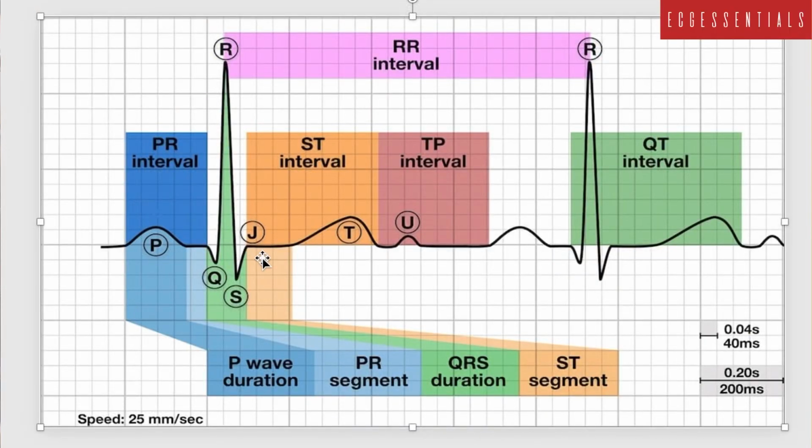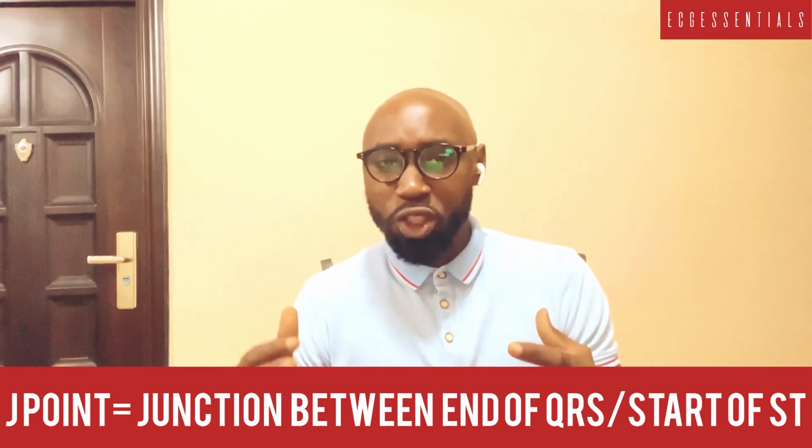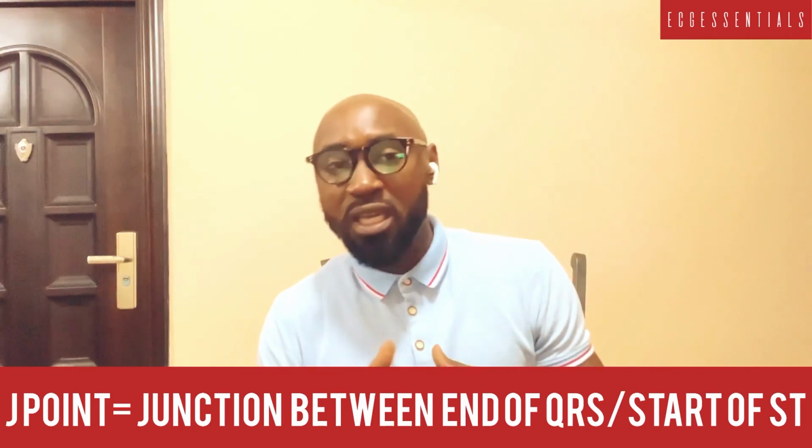Then after the QRS complex, we notice that there is the J point as shown on the image, the J point, the junction point. That is actually what it means. And as the name suggests, it is that junction between the termination of the QRS complex and the beginning of the ST segment. Normally, the J point is situated on or just above the baseline.